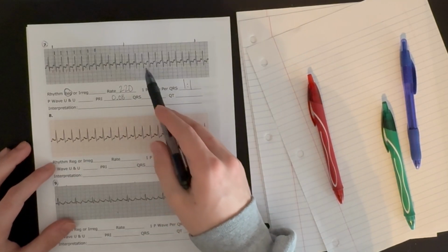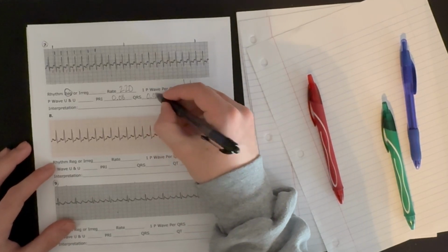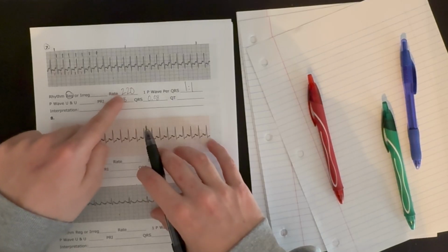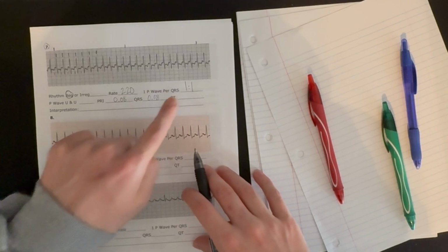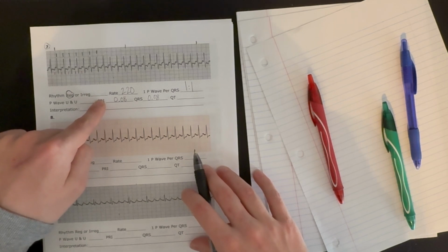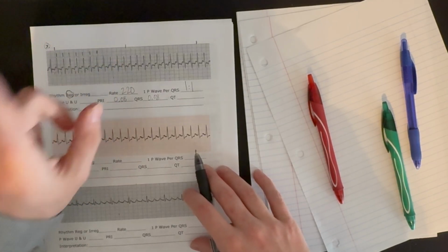Lastly, our QRS complex. Is it wide or narrow? It's narrow, about 1.5 to 2 boxes each time, so about 0.08 seconds. So the question is, what do we have here? We have a regular rhythm that is extremely fast, 220 beats per minute, very tachycardic. But we have a P wave for every QRS complex. We have a PR interval that is shorter than normal, but consistent. It is the same every time. There is no slowing or speeding up of the signal. It stays a little bit quick, and that is, again, a result of this very fast heartbeat and one other thing which we'll talk about.